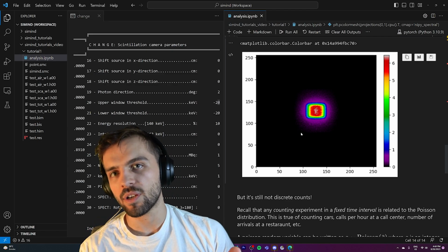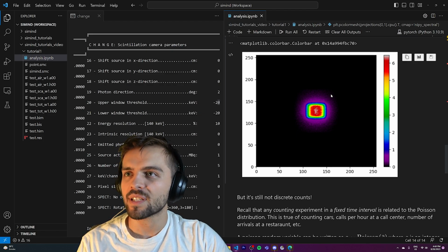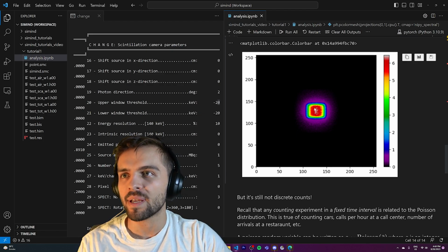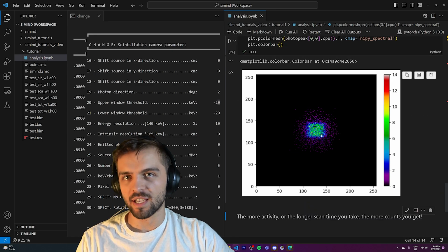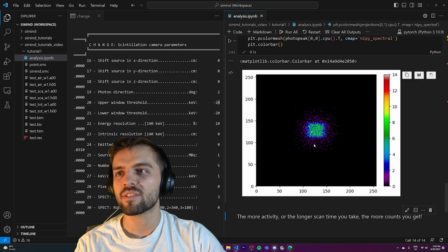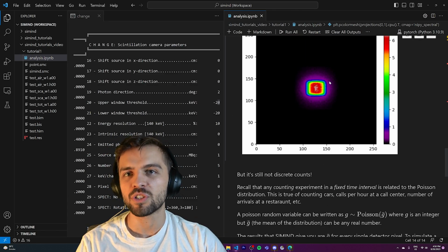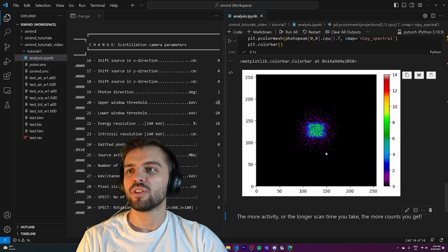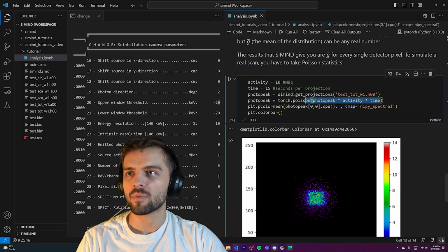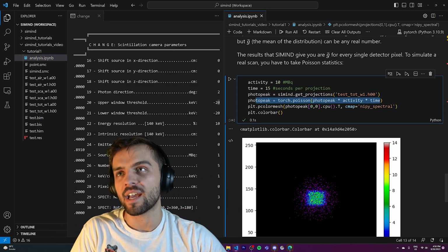Now, there are a few things that I want to end with before we end the first video in this tutorial series. You'll notice that this data here is a little bit noisy, and of course, when you take a SPECT scan, you expect to get noise. Another really important thing is that the noise in this and the noise in this come from very different sources. The noise in this comes from drawing the Poisson random variables, which is us simulating a real counting experiment in a real SPECT scan.